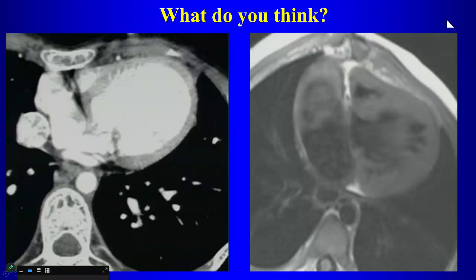Now here's a pathognomonic finding that you might see on imaging for this particular congenital heart disease. What do we see here? Is this a hypoplastic right heart? Yeah, the right heart is small, but why? Tricuspid atresia? Yeah, how do you know it's tricuspid atresia?